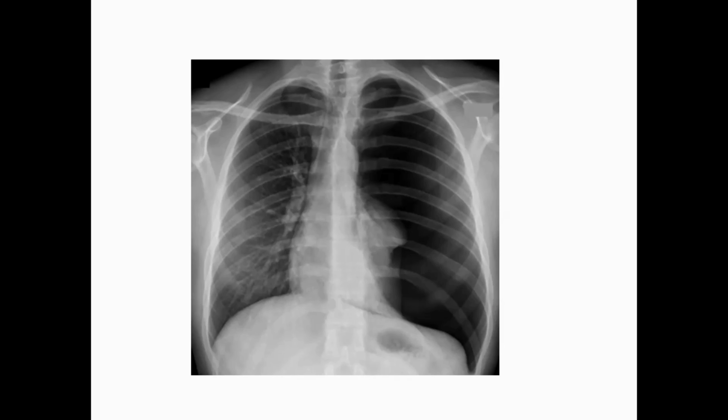Okay, so let us discuss the other topic, which is pneumothorax. Even a medical student, if they miss such an X-ray, no one is going to defend you, because this is an emergent and life-saving X-ray that needs to be well spotted and diagnosed. Okay, so as you described, it is radiolucent. Radiolucent means it is black.